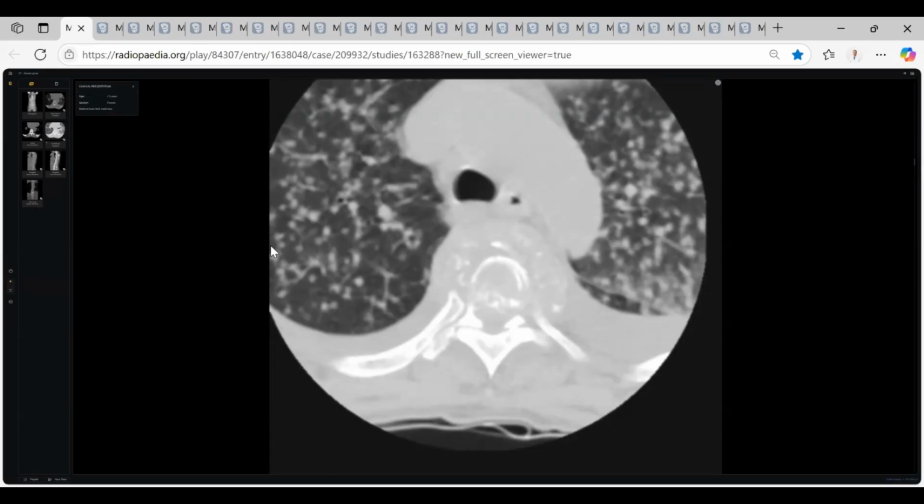Though there is also prevertebral soft tissue, a prevertebral collection is noted along with the fragments, and cord injury, as I already told. Apart from that, in the lungs I can also see multiple interstitial thickening diffusely, with some nodularity in both sides of the lung.